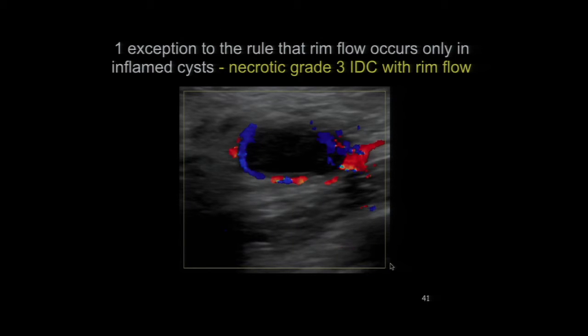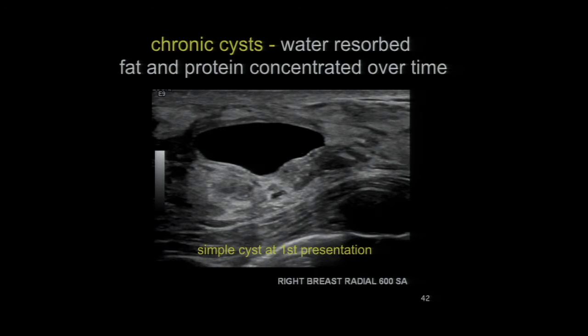Have I ever seen a false negative? This is the only one. This was a necrotic grade 3 invasive ductal cancer that was totally liquefied centrally. It's the only time I've had a false negative on the parallel vessel sign.